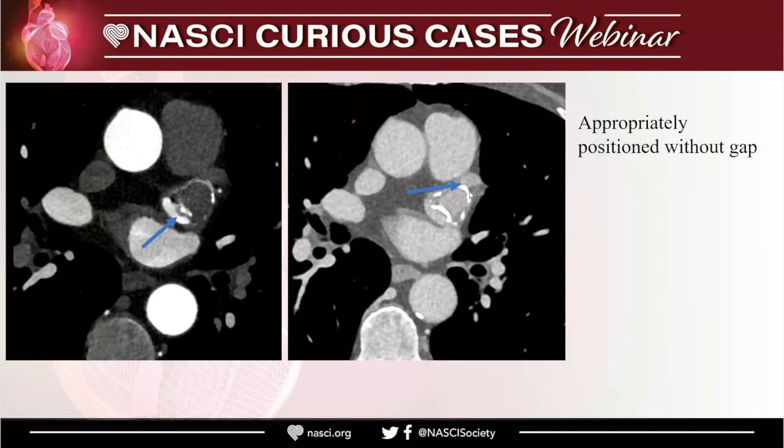Then what do you do with this hypoattenuated thickening? Is it just hypoattenuated thickening or thrombus? What is agreed upon is that if it is less than 3 millimeters, you call it hypoattenuated thickening. If it is more than 3 millimeters, you call it thrombus. That's what we practice. Does anybody want to give any comment here? Okay, I think you probably agree or don't want to correct me.